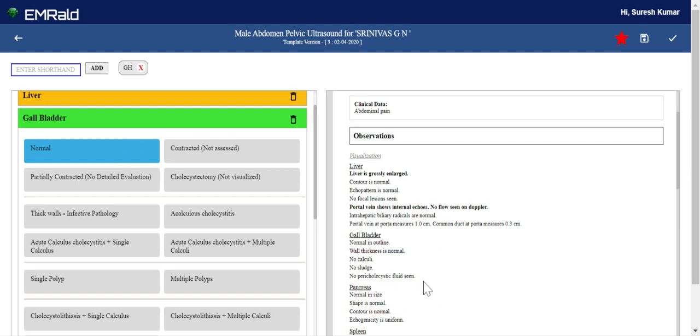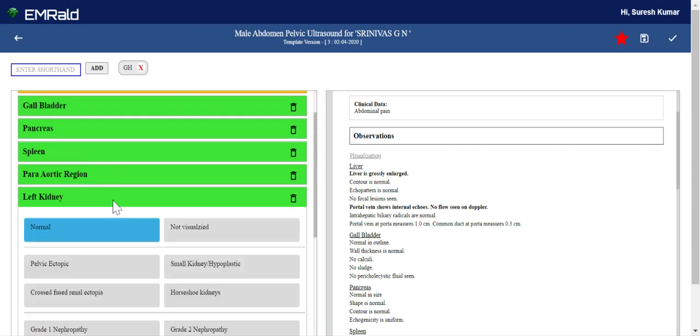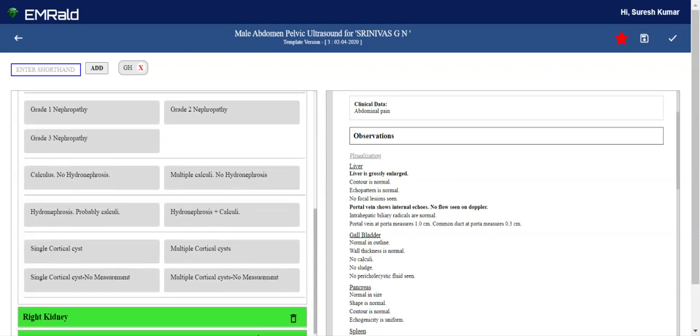The description here represents that the gallbladder is normal. You proceed, nothing to be done for the gallbladder. Probably nothing to be done for the pancreas and spleen, etc. either. So things are okay. Then you hit the kidneys, and there you notice that there's a problem. Fair enough. And what might that problem be?